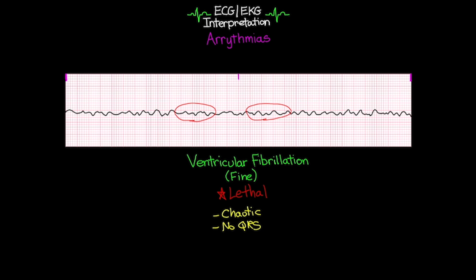And so unfortunately, if you're seeing this in your patient, you probably have less of an opportunity for a successful defibrillation. So hopefully if you are going to encounter this with your patient, you can catch it early while it's still in that coarse VFib stage, because once we progress to this point, you're going to have a much harder time getting that patient back.